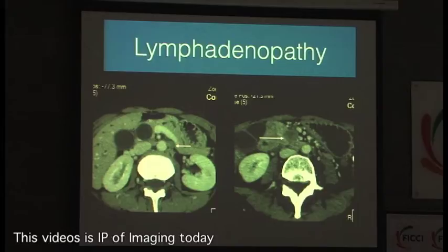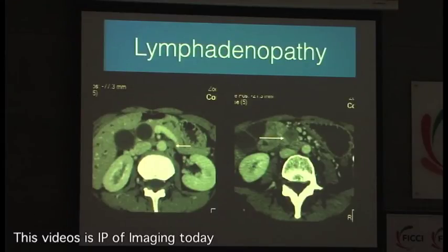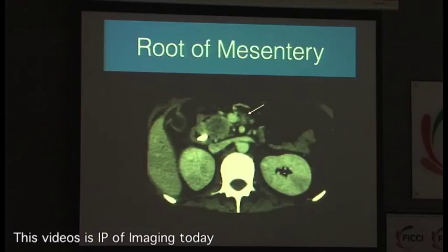That's a big lymph node again. Necrotic, definitely involved. Okay, and this is a lymph node, again to the left of the SMA and the mesentery. These patients definitely should not undergo surgery. They are not going to get an R0 resection in any case.